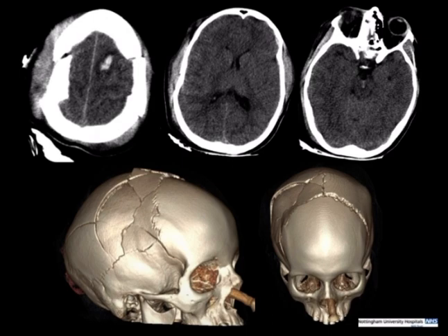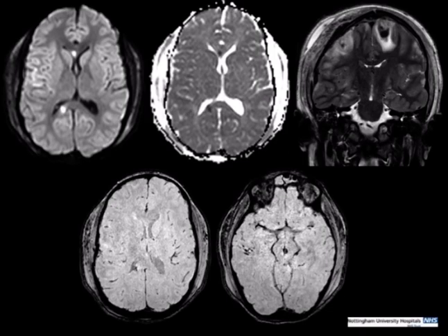So she went on to have MR, and as you can see, there are a mixture of findings. The diffusion signal is restricted in the corpus callosum, a very typical distribution for diffuse axonal injury. It's not all hemorrhagic. There's possibly a little bit of hemorrhage in the posterior part on the susceptibility-weighted imaging. But the SWI picks up extra parenchymal injuries. You often see these shearing subcortical hemorrhagic lesions at the grey-white matter junction, in addition to all of the more obvious parenchymal contusions and swelling.